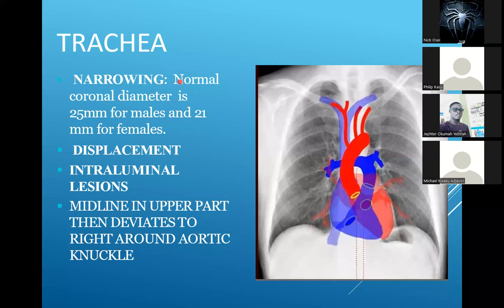Then, when you start interpreting the X-ray proper, the first thing you want to talk about is the trachea, whether it is displaced or not, and that has very valuable information. Now, in a normal chest X-ray, can you all see the trachea on this X-ray? Yes, Doc. Okay, very well.